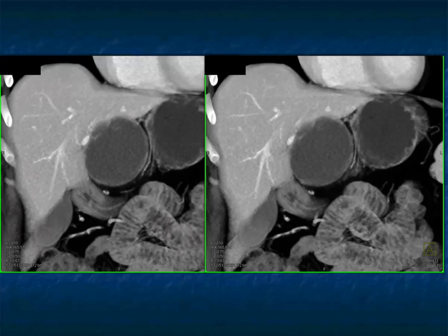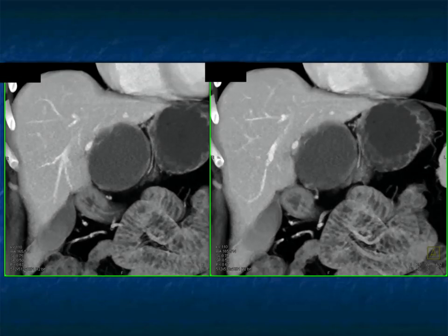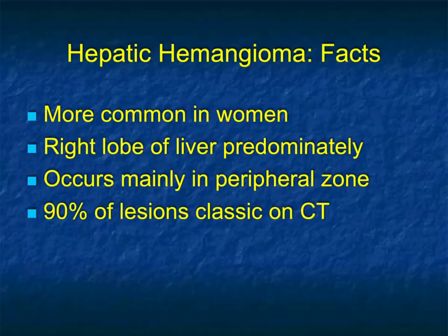But you could see that you might think about a complex cyst, but cystadenoma is something you should be considering in this appearance. Other things you might have considered, could this be a choledochal cyst? But I don't see a dilated common duct or communication with the common duct.